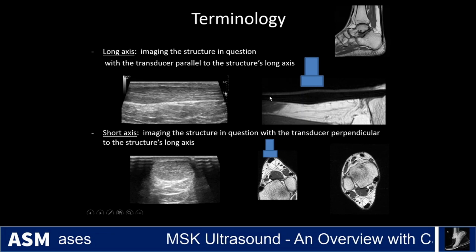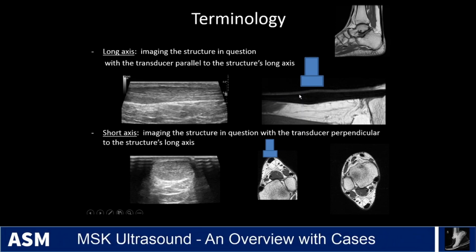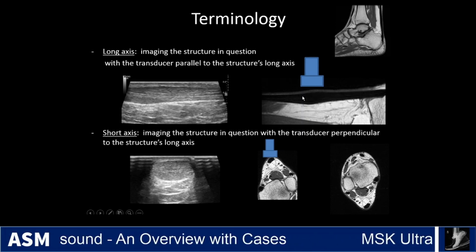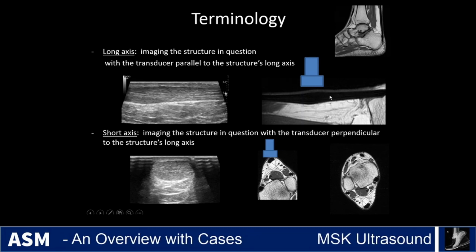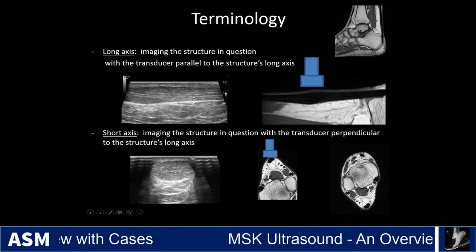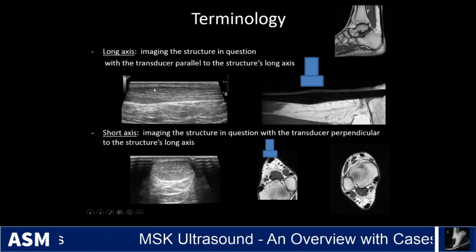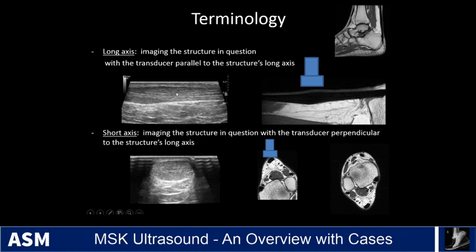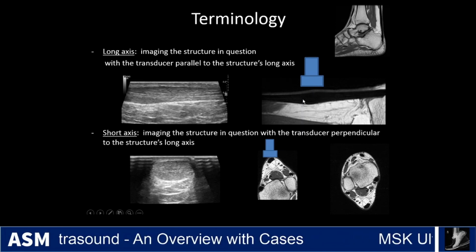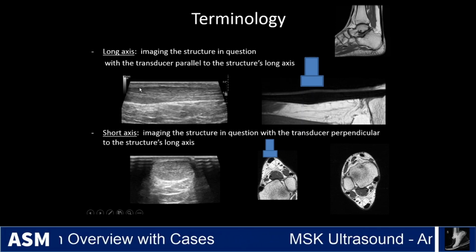On the proton density image that we have here, you can see the dark signal of the tendon. You almost can see a linear fibrillar pattern of the tendon as you're going through it, but it's really not as apparent until you go to the ultrasound. You can see that pattern here, the microstructure of the tendon, to a much better advantage, in part due to the better spatial resolution. Notice the normal appearance of the tendon here, and then this mid-substance area of tendinosis, where the tendon, because of degeneration, has focally thickened, and that's this area right here.